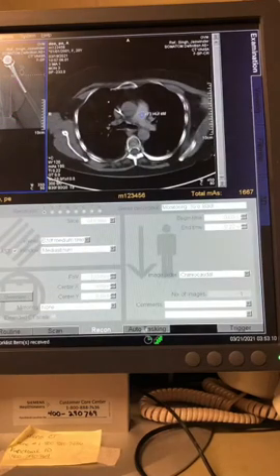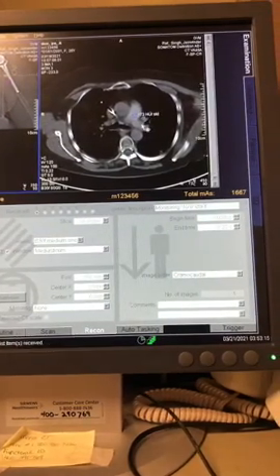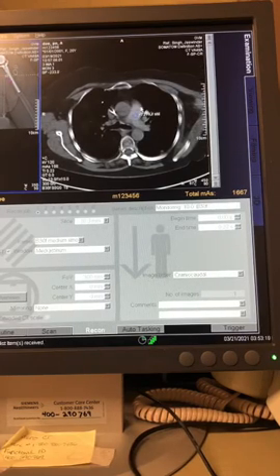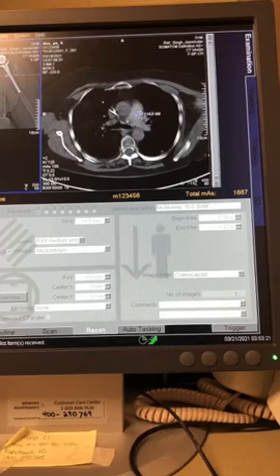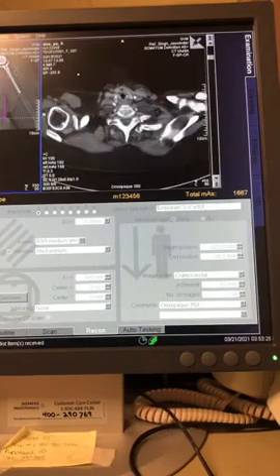And just so you know, instead of 100 like the chest, this PE on the P3T protocol actually triggers at 20 Hounsfield units. So it's incredibly fast. All right, so if we come over here, let's look at what we got.